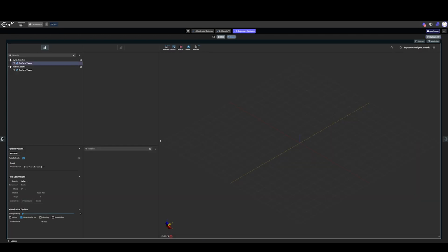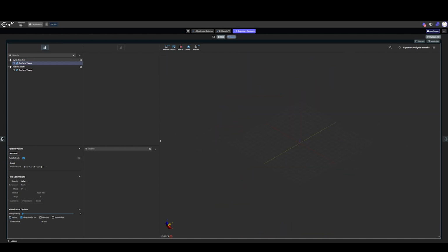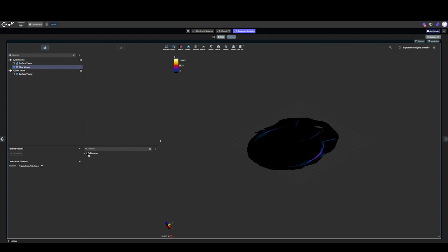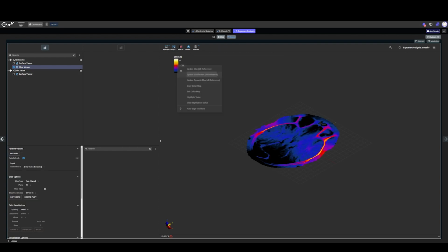The final and optional step 3 provides extensive functionality for in-depth exposure analysis. The entire process is presented as a step-by-step guided mode application, which greatly simplifies the use of the tool.